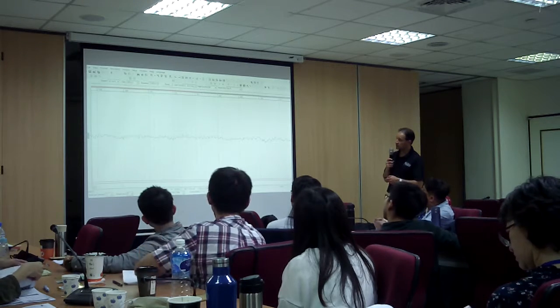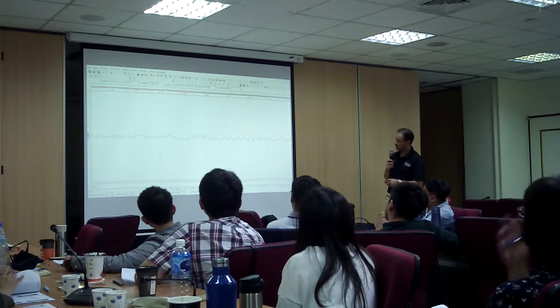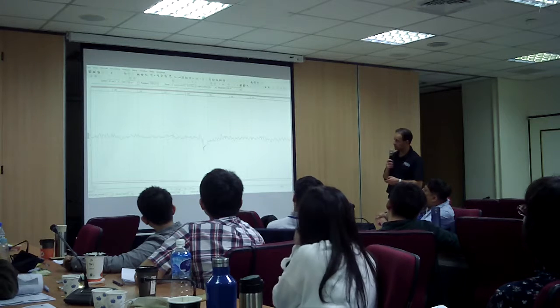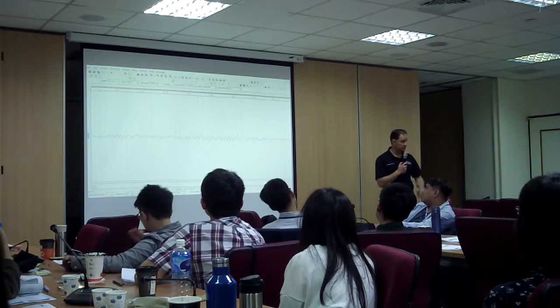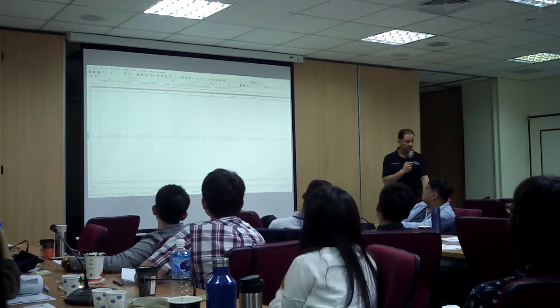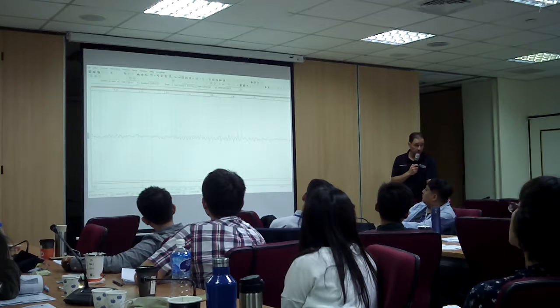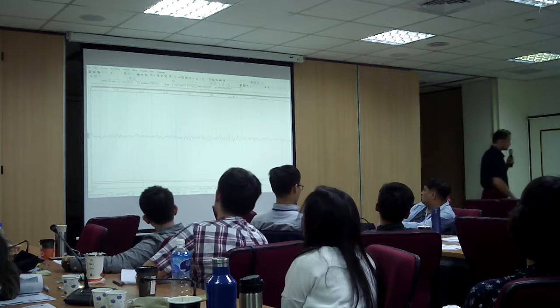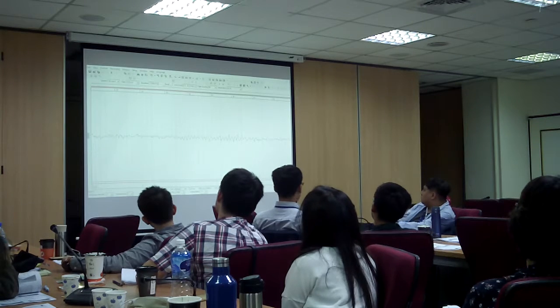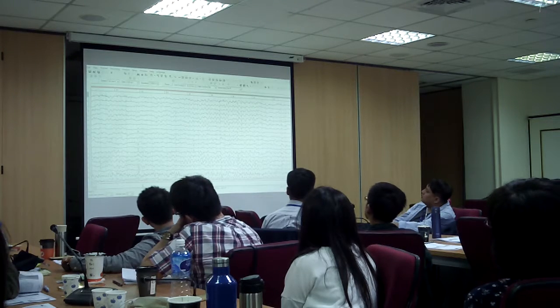There it is again. So you see the rhythmicity, right? Look at that. Look at the slowing. It's quite significant, isn't it? So what's causing the hyperactivity? Is it this? Is it the epileptic discharge? Is it the food that they're giving him? What's causing it? What do you think is causing the hyperactivity? Is it one thing? Is it everything? Is it a combination of things?